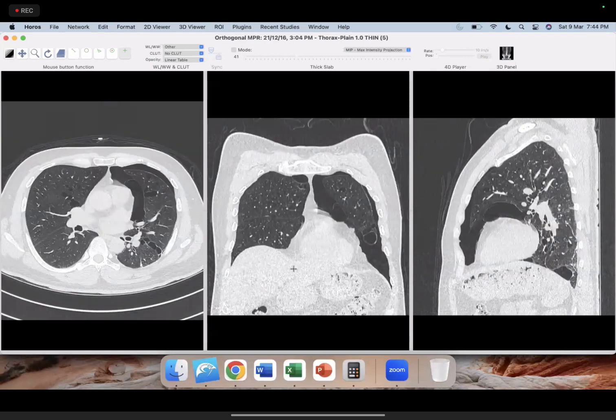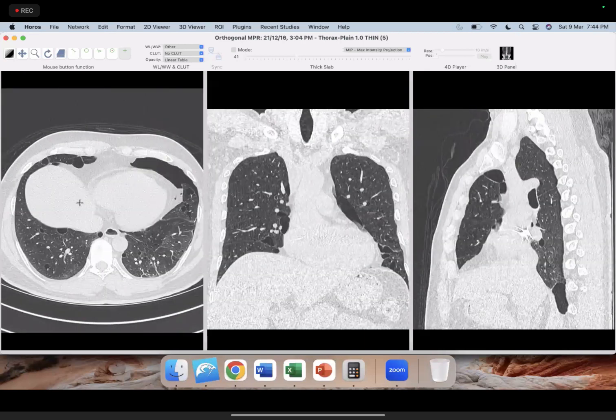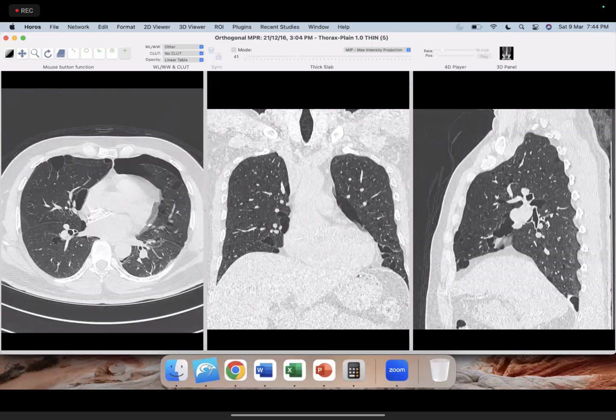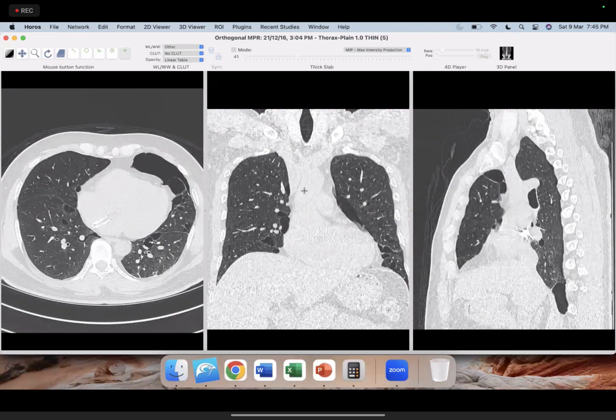But now notice the difference in the shape. It is not rounded like we saw in the previous example. Here you now start looking at bizarre shapes, like this is lenticular, this is somewhat triangular or a clover leaf. This is also a lobulated cyst. Here also again you see a septated cyst. With this type of heterogeneous morphology, you start thinking first of Birt-Hogg-Dubé syndrome.